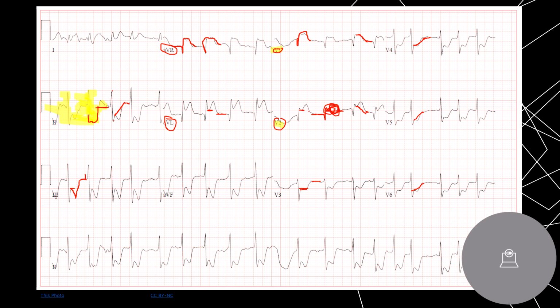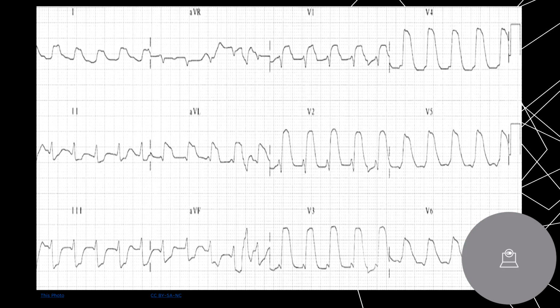That's probably right at the left main coronary artery. That's kind of getting deep into it, but that's one of the cool things about AVR. Like when you guys get beyond scratching the surface of EKGs, like AVR is something to take very seriously.